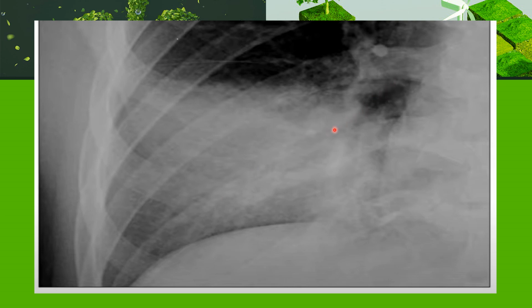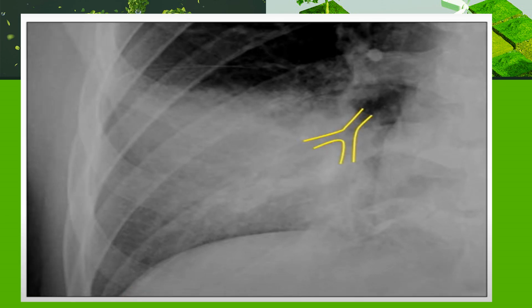We can see it closely here. You can trace the bronchus, which is around that radiodense, whitish or grayish opacity. This is all fluid and consolidation around the bronchi, but still in between there is some air-containing opacity, air-containing alveoli can be seen, and that is known as the air bronchogram.